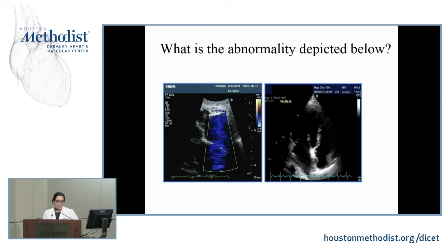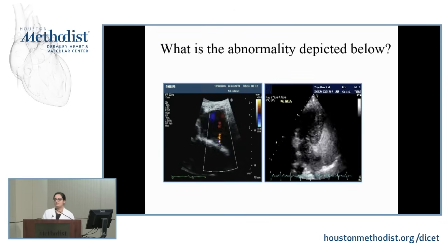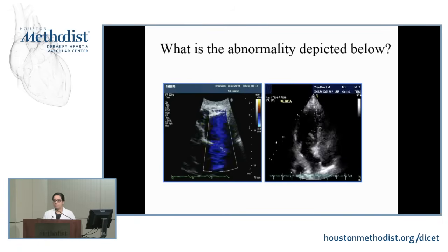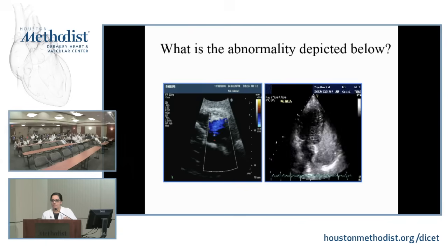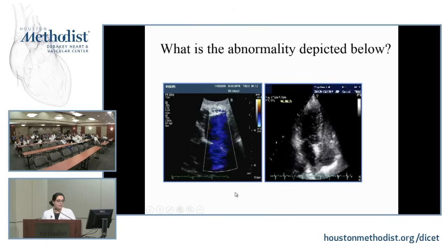What is the abnormality here? It's pretty obvious, right? This is a patient in the ICU post-operative that developed hypoxemia post-LVAD insertion. Any takers? It's pretty obvious. It's a PFO, right?